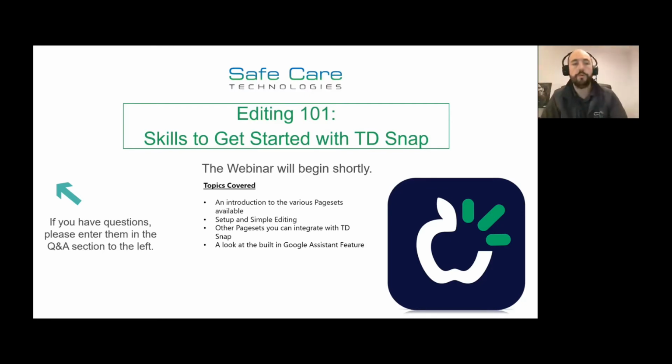So what we're going to be doing is covering skills to get started with TD Snap. Just kind of the basics, an introduction to TD Snap, really. We'll be doing the introduction of the various page sets that are available on TD Snap. We'll talk about a simple setup and simple editing as well. We'll also go through the other page sets, just to give you an idea of what other page sets are available on TD Snap. And finally, a quick look at the inbuilt Google Assistant in TD Snap now as well.